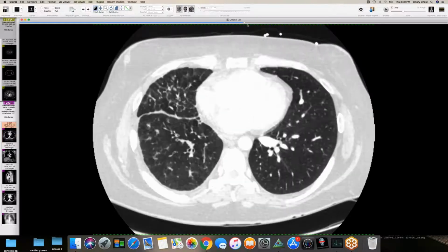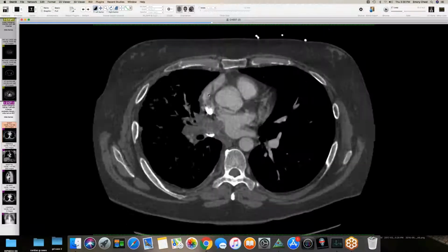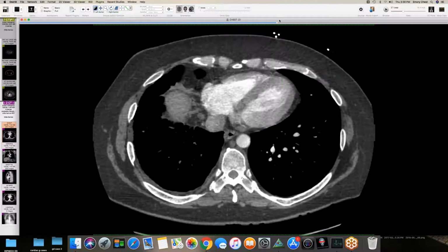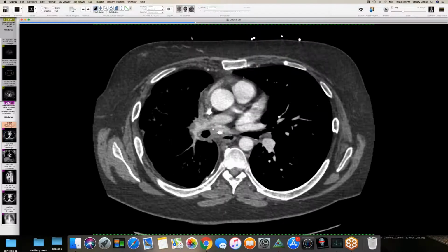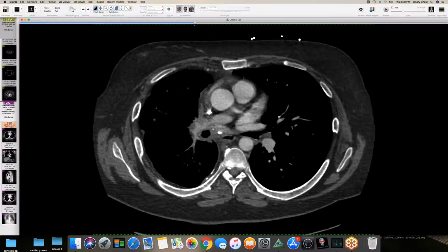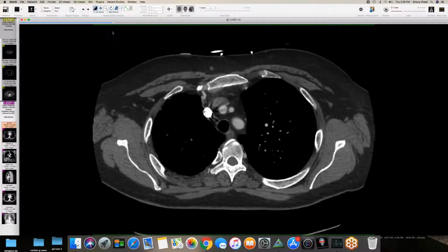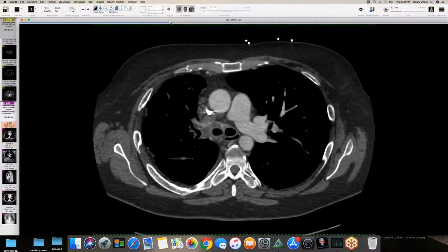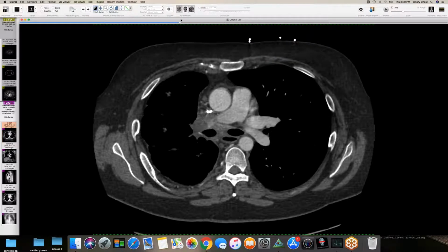Okay. The pleural disease is interesting in and of itself. We've seen cases like this before, but clearly this person has calcified fibrothorax as well, which is interesting. Not that surprising, but one could easily ascribe that to the infection as well. It just produced a pleuritis as well. And the whole lung is small, presumably because of that process. And so I would have thought chronic, this happened years ago.